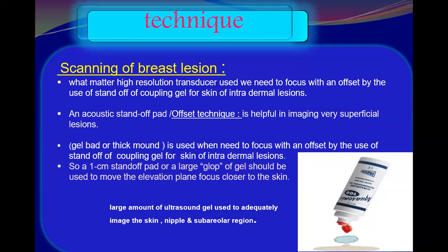For the high frequency transducer, yes, the focal or narrow zone is near toward the skin, but it is not very superficial. Still, the skin area will come at a little bit wider area.